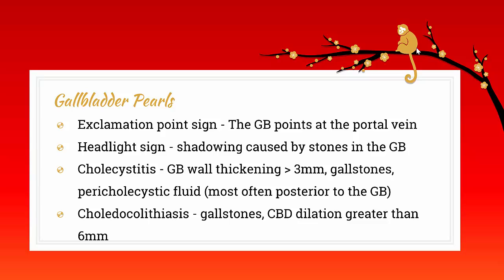Choledocholithiasis is present when the common bile duct is dilated greater than 6 millimeters and stones are present, or 6 millimeters plus 1 millimeter per decade above the age of 60 years. So for example, if you have an 85-year-old patient, the normal diameter for their common bile duct is going to be 6 plus 2, so 8.